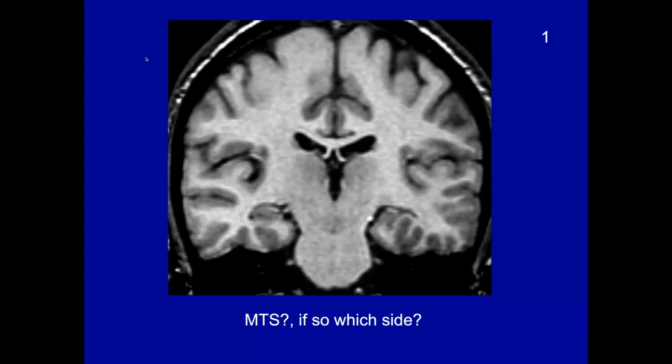Alex, when you ask side, you mean the patient's side, is that correct? Correct. Yeah, I probably should have been clear about that. Thank you. So yes, obviously from a convention of imaging, this is the patient's right side, this is the patient's left side.